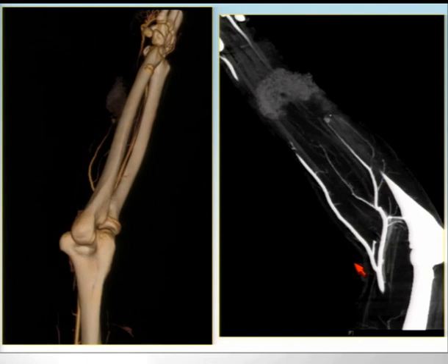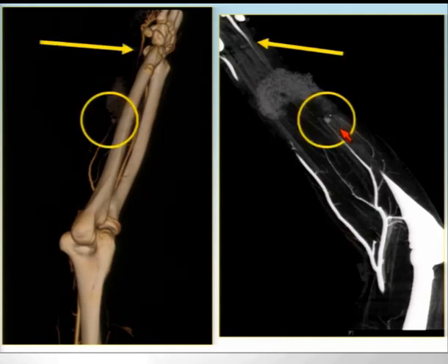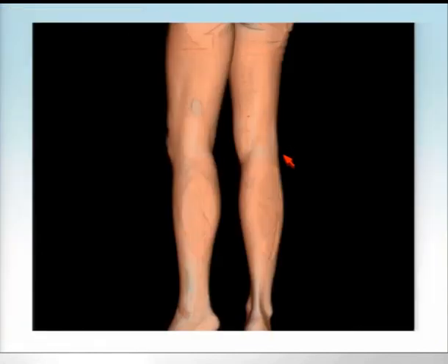This is a patient that suffered penetrating trauma to the forearm, and you can see a small pseudoaneurysm or active hemorrhage originating from the ulnar artery, short segment of occlusion, distal reconstitution at the level of the wrist. This is the processing artifact. The radial artery was in fact quite normal, but you can see a very high quality in this patient's extremity CT angiogram, and this is sufficient to guide management, very importantly.